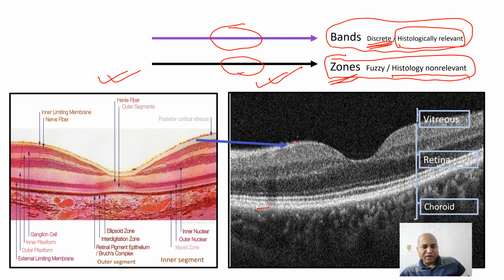And then comes the nerve fiber layer, which is usually seen as a layer which is more defined on the nasal aspect, which is closer to the disc. And the portion further away, or temporal to the fovea, has a nerve fiber layer which is thinner and less defined. So in any eye where you see that the nerve fiber layer is thicker, this means it is closer to the optic disc.